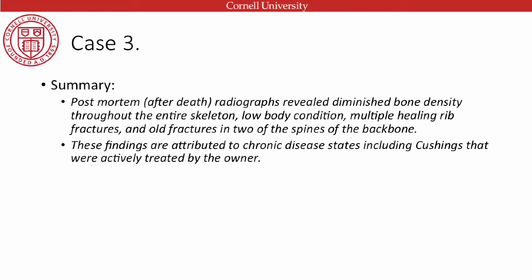These findings attributed to chronic disease states, including Cushing's, that were actively treated by the owner. So this wasn't an abuse situation. This was a case of a dog that had diminished bone quality from chronic disease, probably Cushing's related.